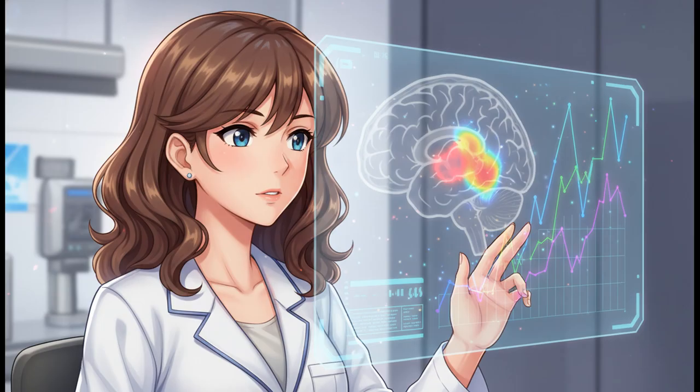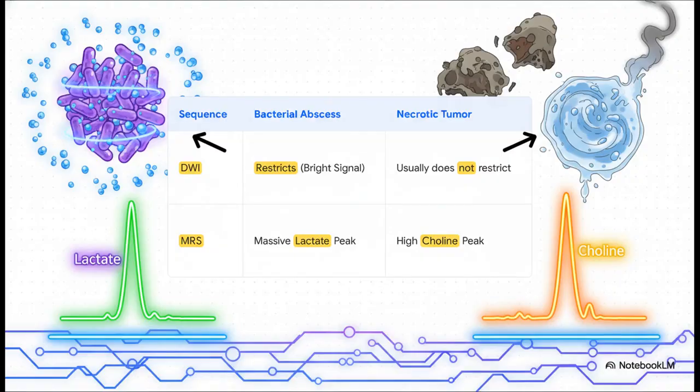Well, this is when you stop looking at just the anatomy and you start looking at physiology. It's time to bring in the big guns, our tiebreakers, the advanced imaging sequences. And this, right here, is the slam dunk. First, look at diffusion-weighted imaging, or DWI.